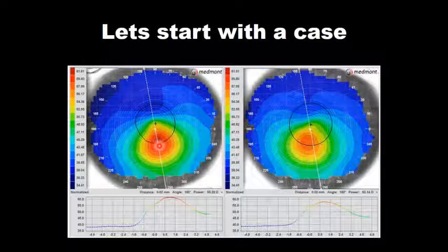Could we fit this patient with a corneal GP, or could we fit this patient with a soft lens? What would work for this patient? You might look at the amount of power within the pupil, and we see this patient goes from beyond 60 diopters to somewhere around 38 or 39 diopters. So from 39 to 60, just within the pupil, there's about 20 diopters of power.